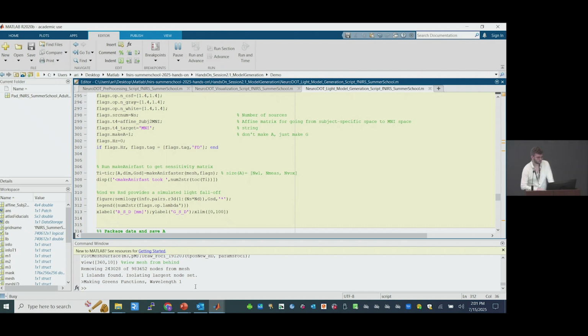Hey, Ari, I was just going to mention some of these steps that you left out, for example, creating the high density mesh. I think you described those in the PowerPoint tutorial for alignment, and it's actually quite well done in that tutorial. That is correct, yeah. Thank you for mentioning that, Mike.